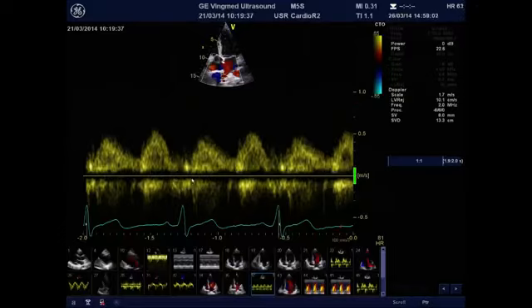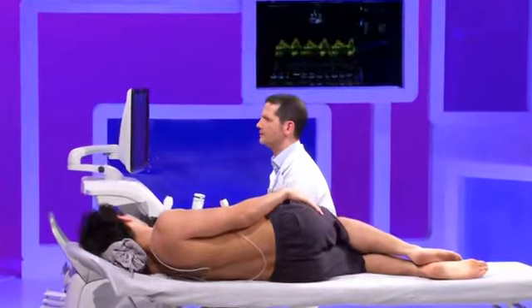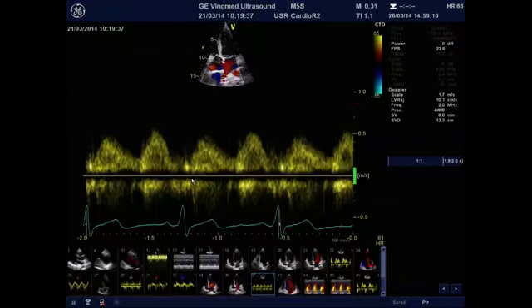Okay? Now, I told you that the duration of the mitral A wave is an important parameter, and it is very important to compare in the same patient the duration of the mitral A wave with the one of the pulmonary vein AR wave. The idea behind this is if we think what happens when the left atrium contracts.